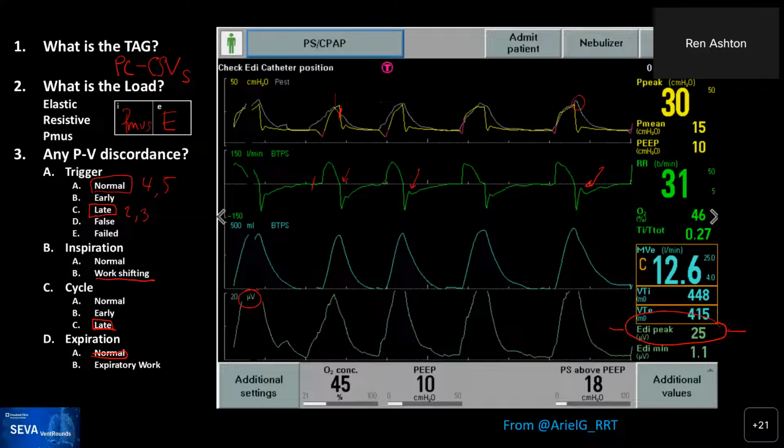Yeah, fair point. I see what you're saying. So you're saying it should look like this, and all of that area is not being supported? No, I don't think that's true. If that white line is the simulated NAVA pressure, that's always going to be proportional to the EDI signal. The NAVA pressure waveform is not square. It's whatever the EDI signal says it is. Rob, but since NAVA wasn't working at the time, there's no gain. The gain was 0, so that's pure EDI signal.